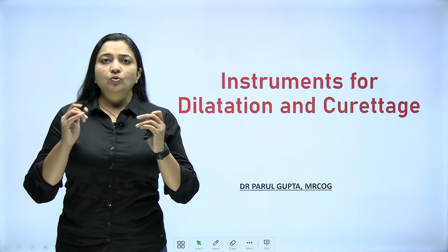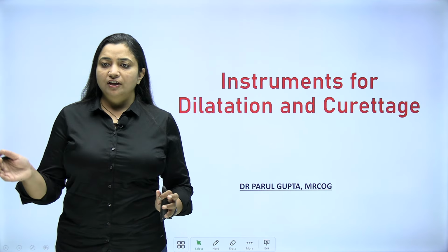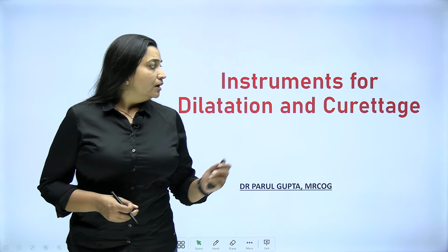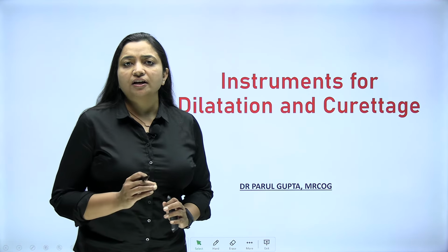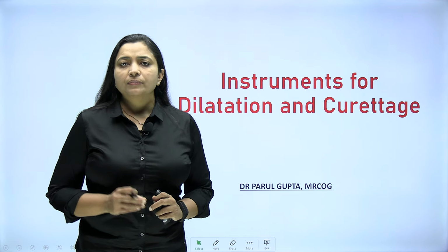This is for those undergraduates and postgraduates for your table vivas where you need to pick up the instruments and speak about it. Okay. Now, first of all, what is the difference between dilatation and curettage and dilatation and evacuation, that we need to know.